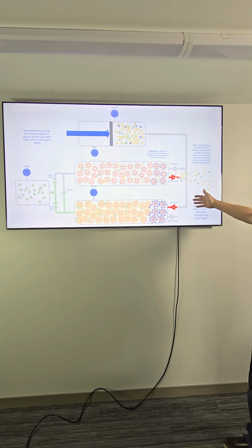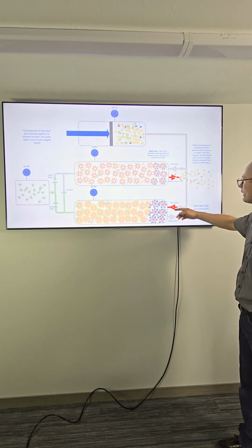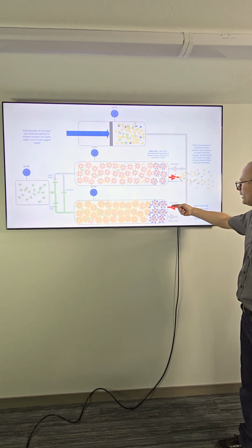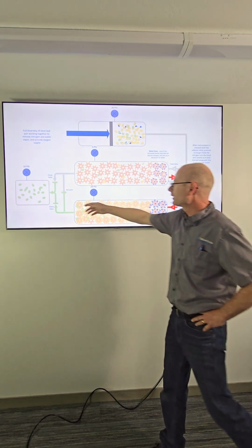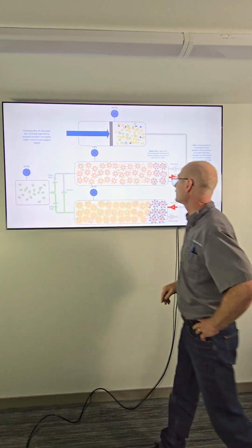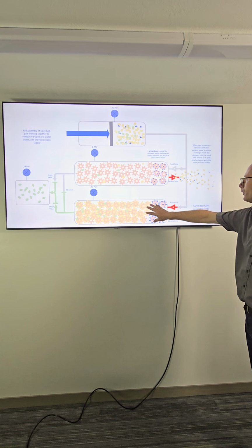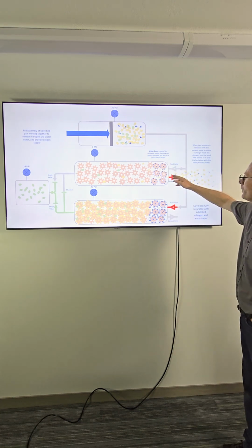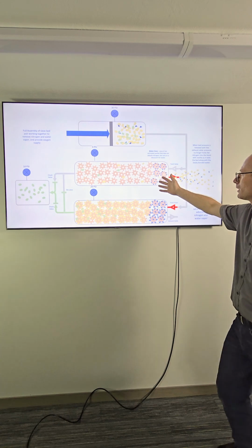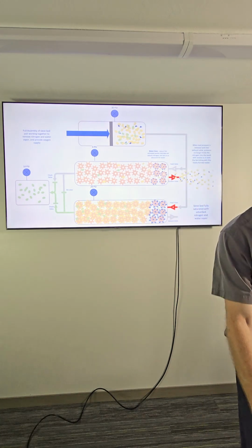So in this diagram, the red indicates valves that are open. So now I've got a feed valve and an exhaust valve on each of these. I've got these two check valves and I've got an EQ valve. So this one now is fully saturated. This one is exhausting, so the pressure is down to close to zero. This one's under pressure, all the nitrogen is stuck to the sieve material.